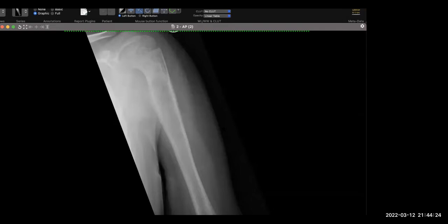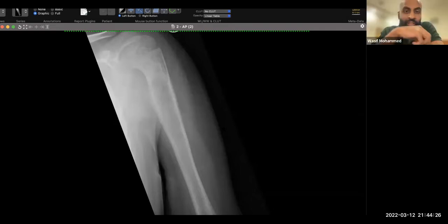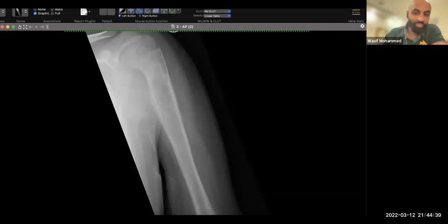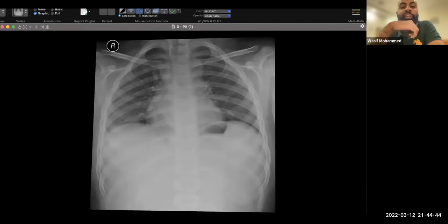So this is an aggressive permeative bony lesion in a skeletally immature patient. My differentials would be 1, 2, 3. You don't need to think about them. It could be an osteosarcoma, Ewing sarcoma, leukemia, or lymphoma. Don't forget lymphoma. So here's the chest X-ray. If you had said lymphoma, I think you would have considered lymphadenopathy as a significant finding, but since you didn't consider lymphoma, you just ignored the lymphadenopathy. In addition, this patient also has an enlarged spleen.